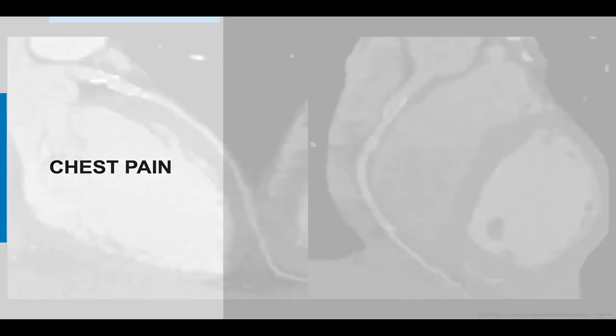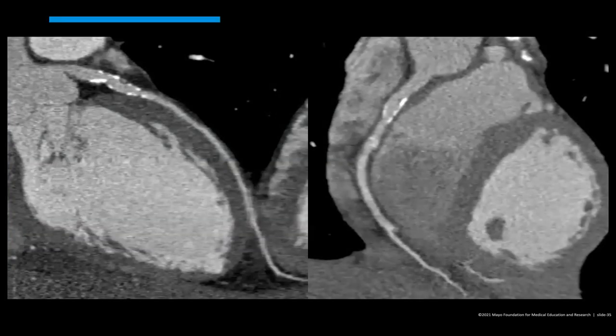Okay, so next case, another patient with chest pain. All right. So we're seeing a sagittal and looks like a curved reformat view of the LAD coming down.